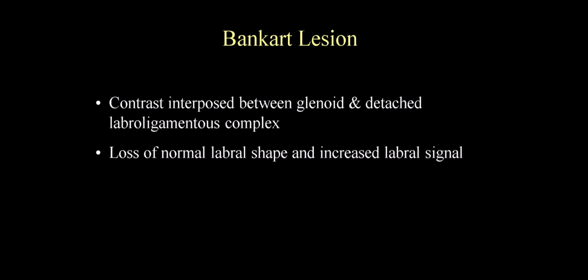So when you have that, it's the anterior inferior quadrant, which is really where we're always very concerned because the anterior dislocations create the impact and the damage there. So we're looking for the loss of either the shape, or increased signal, or detachment within it.